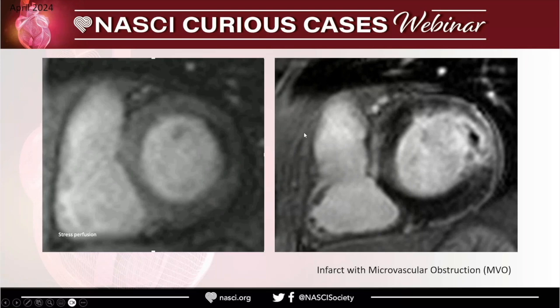Yeah, so like I put it here. You see the extent of delayed enhancement, then we have a little bit of microvascular obstruction that Dr. Kavakos taught us today. And then you can debate how much peri-infarct ischemia, but the point here is that you cannot always go with rest if you're doing the rest after the stress, because there may be some contrast enhancement.